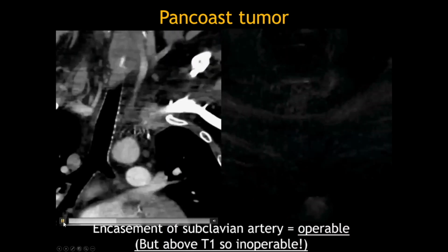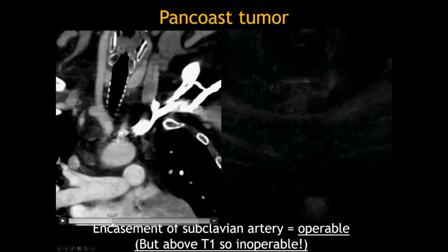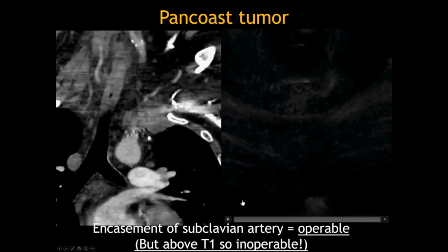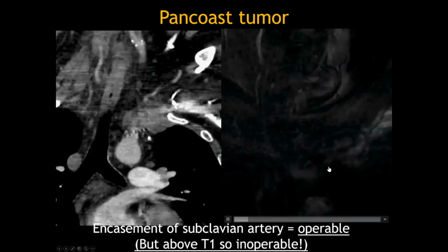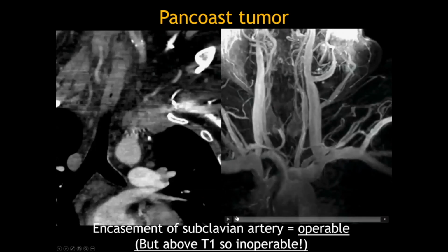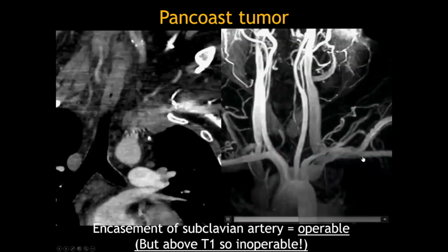And here's just the corresponding chest CT, just the zoomed in image showing the encasement of the subclavian artery by this mass, extending above the first rib and T1, indicating that this is an inoperable tumor. And this is the contrast-enhanced dynamic MRA, just showing nicely the vascular narrowing of that subclavian artery related to the tumor itself.